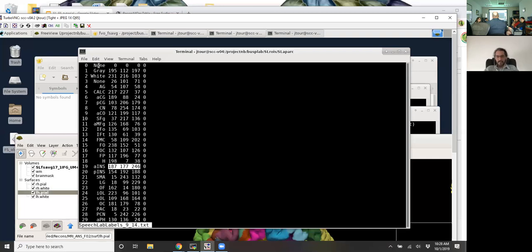But what Freesurfer did, and I think the reason is that it realized people might start using different lists, and you also have these two different spaces. You're talking about surfaces, where you have one precentral gyrus or one motor cortex in that file, versus a volume that has left and right, so you have a left motor cortex and a right motor cortex.